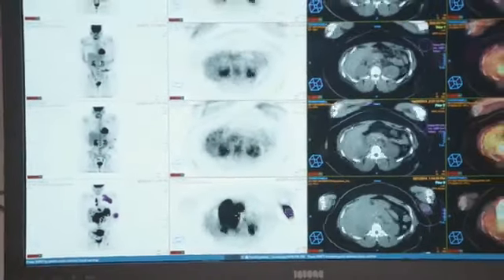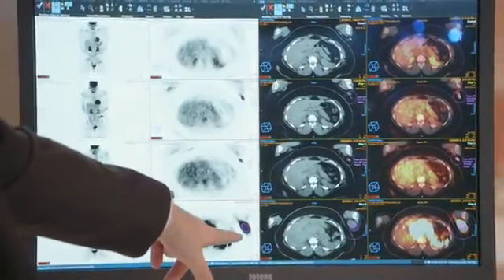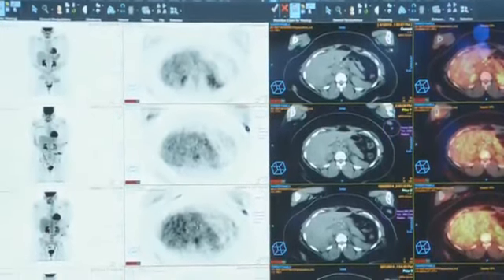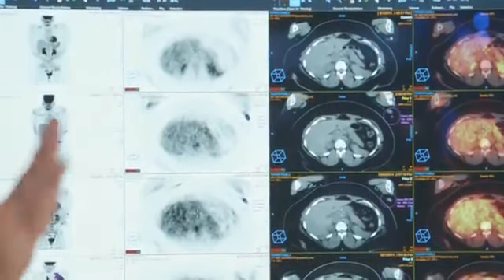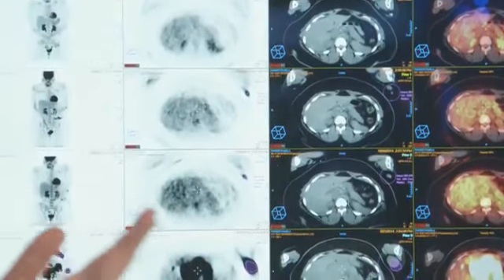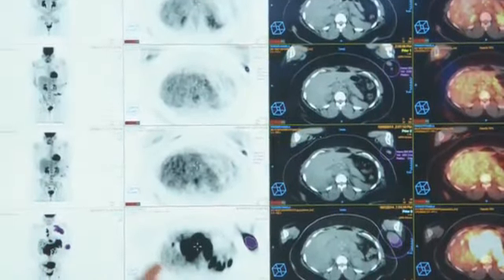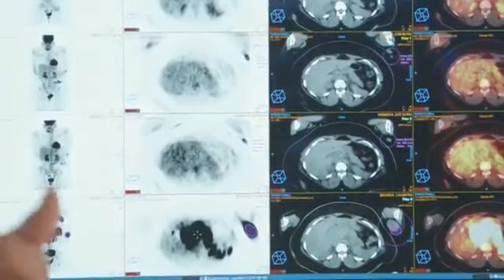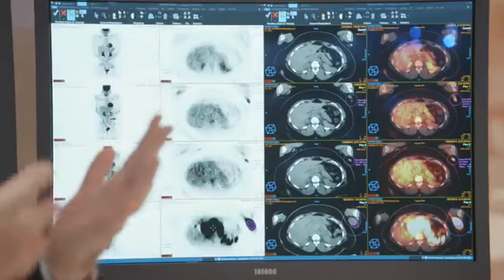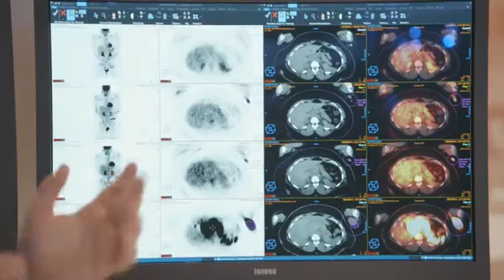As you can see here, you can see a lesion which was marked with a sphere. What we're talking about is that the whole radiology workflow separates between quantitative and qualitative. Some customers, some sites use qualitative measuring, a qualitative impression of the study, like saying this looks like it's better or worse, and sometimes they use actual numbers.